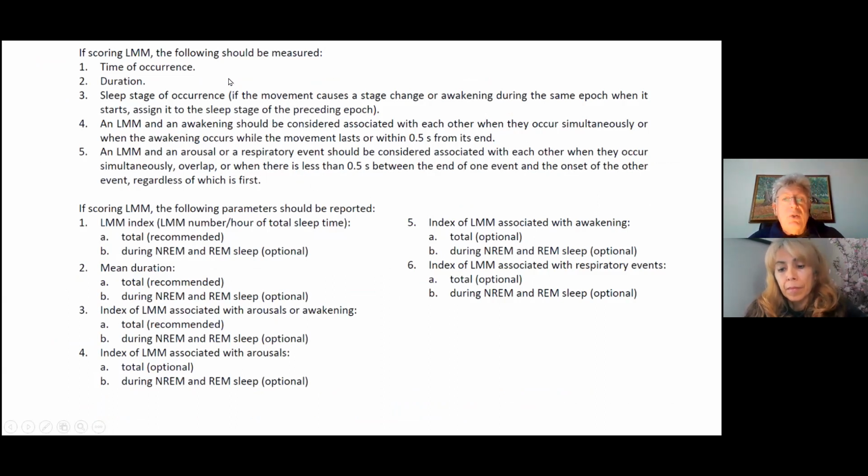So what should we measure once we have detected the movements? Of course, your attention at the moment will be focused on that first part that we have just explained. But usually the computer is able to do this type of measurement, and if the computer is not able, we have to know what we have to note down.